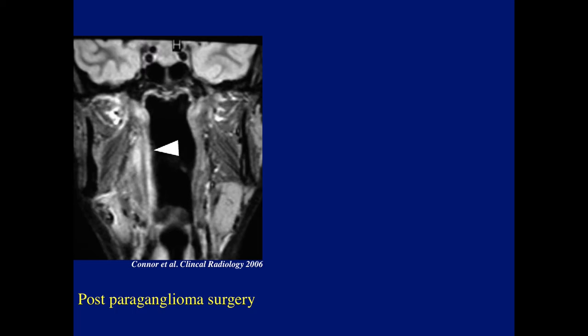Correct. There's Gino, and Nate, said, and Asif, denervation atrophy. This was actually acute or subacute. See all this bright signal here. This is actually a STIR image.